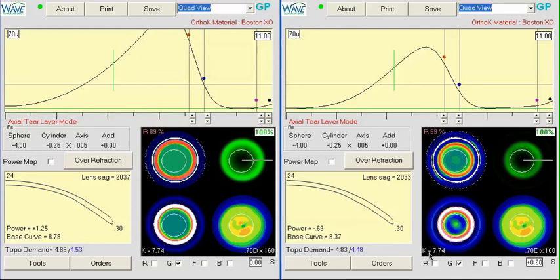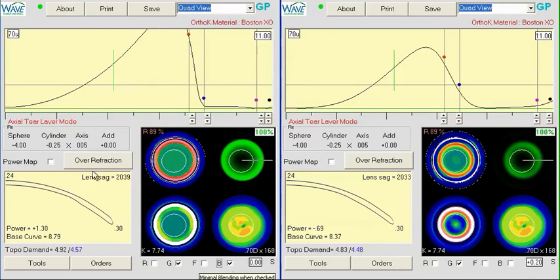So, turning off the blending so that we get sharp curves. Even though it doesn't show that much here, I have seen, usually we'll get a more distinct post-wear ring on the cornea, and the central treatment zone will be a little bit wider too.